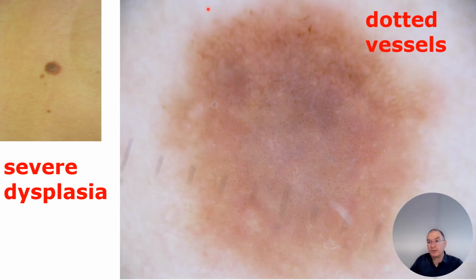Much easier for us to decide. We do the excision based on the peripheral pigmentation, a little bit atypical network, if you would like to say, at the periphery, a little bit grayish here, yeah. It is much easier for us to decide, yeah.